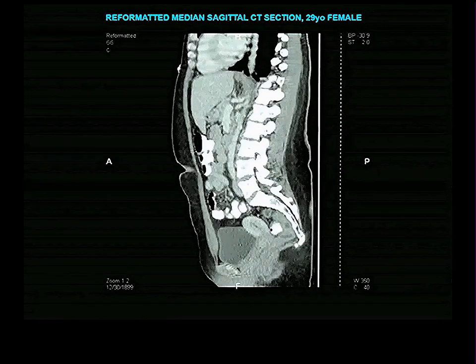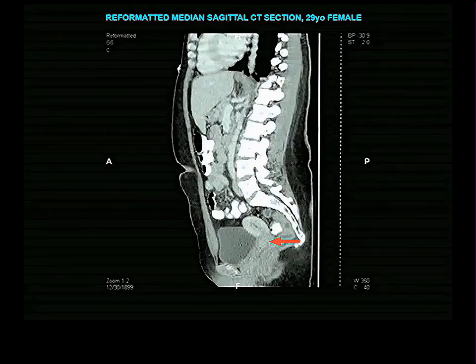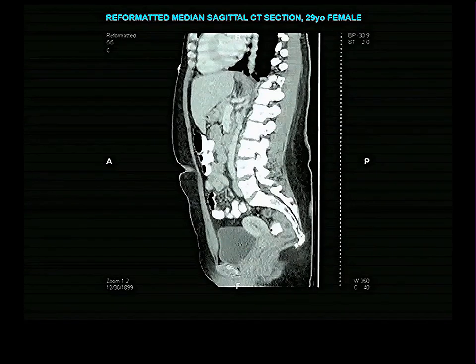Ooh, you need a good imagination to see the cervix of the uterus, which I believe is right here. And that means that this sort of nondescript radio density heading down behind the bladder and inferior to what we would call the cervix must be the vagina. But there's no air in this person's vagina, so we don't see it as that distinct. And the same with the rectum. The rectum is the thing in front of the sacrum, and it's coming down like that, but since this person does not have a lot of air, it just has stool in the rectum, it has the same radio density as the vagina, and so you really don't see a clear boundary for them.